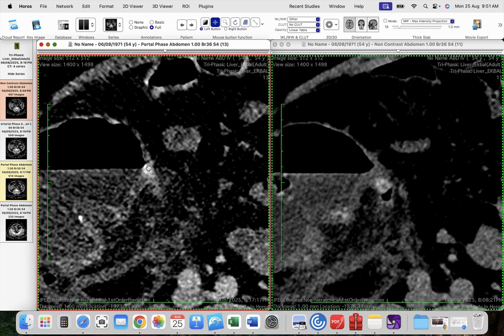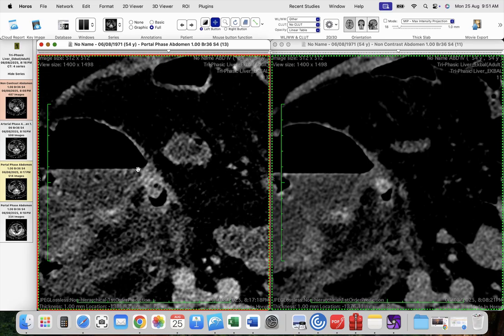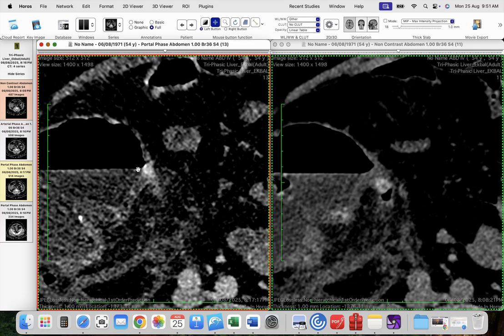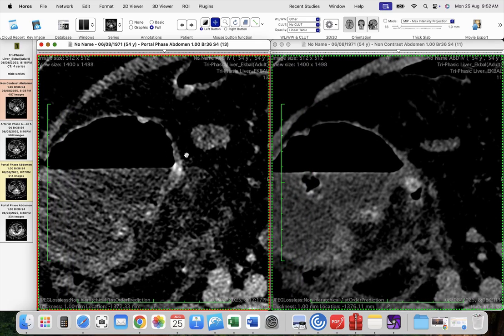It does not bulge inside the lumen of the cecum like any polyp, but I should mention it in my report and leave it to the intraoperative assessment of the whole of the cecum, or the doctor may do a colonoscopy to see it before the operation. He will take his suitable action.